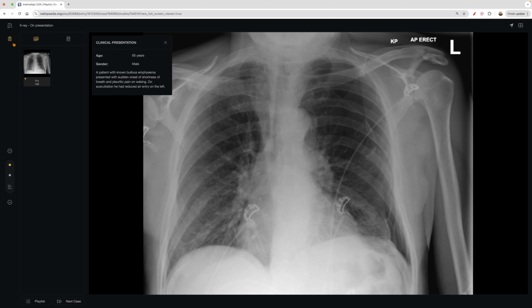And with the patient's history with bullous emphysema, sometimes there's a rupture and you can get air seeping out, and that comes out here and it can't be expelled. And so what happens, it traps. And this is something that needs urgent remediation. And so we go down, go back up. Not too much else to notice. We see the heart here, excuse me. And then we come back on this other side and we're not seeing too much else.